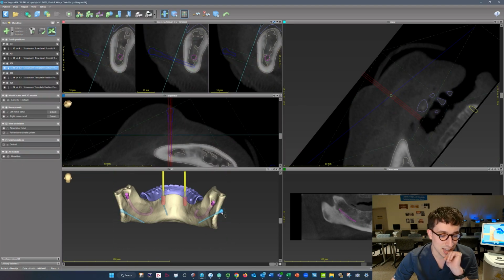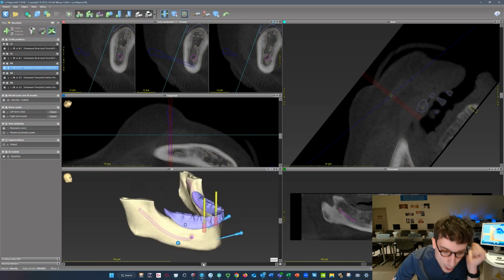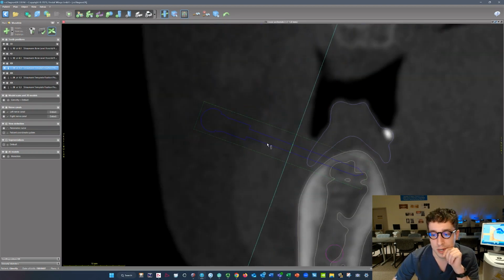And you can see sometimes, oh, that's a good one. I've never seen it do it that odd before. We're not going to be attaching these extraorally, so we're not going to be placing them in there. That is really funny. So let's go to the cross-sectional view, because this gives us a good way to view it. I'm going to move these up.